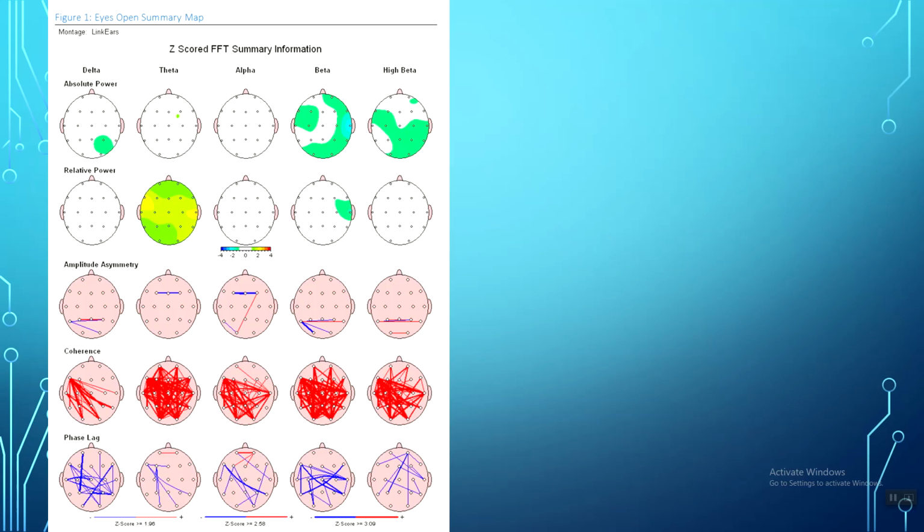So, I don't like this map, to be honest, for a lot of reasons, but I'm just going to work with it because it could be a shitty reference. But what we have is you're drawn to all the connectivity in all the coherence across the board, right? So without me second guessing the recording itself, let's just talk about what this might mean. So we're on the 4th row. Yep, the 4th row down.